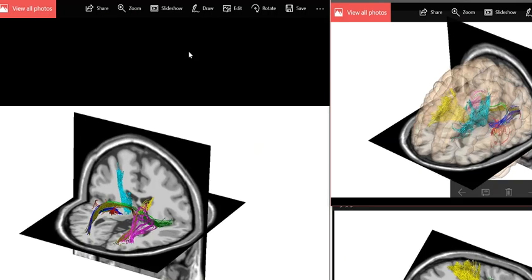This is probably 5 or 6 months down the road, because the first thing we're going to get working are the node functional connectivity and information flow. The effective connectivity will allow you to see both the direction and magnitude of information flow using the phase slope index from the center voxels of the 88 Brodmann areas. The origin of the information will be green on the line, and the direction it's going to and terminates at will be colored red.